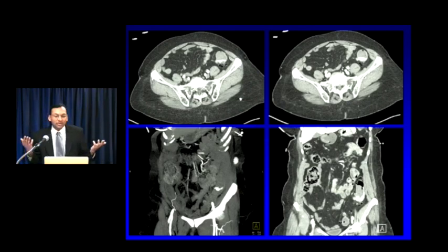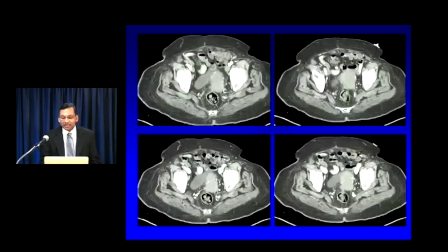But it's not barium, right? This is getting bigger between the 2 phases. This is actually active extravasation. So don't just look for small things. Look also for the larger findings that your mind has a tendency to overlook.